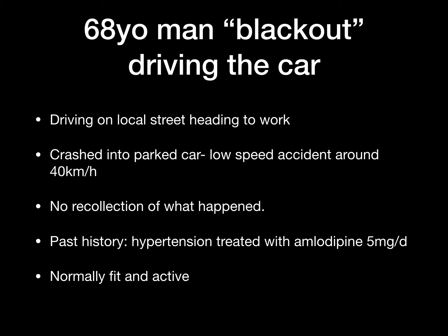arrhythmia. And studies suggest that in people who are really well and assuming that his heart function is normal, who have an altered conscious state or episode of syncope with left bundle branch block, probably 50% of them may have an arrhythmic cause. So sometimes we end up implanting a loop recorder long term to monitor their heart rhythm and try to pick up evidence of bradycardia or asystole that could be causing syncope. So a very different interpretation of this ECG in this clinical context, and yet the ECG is the same.